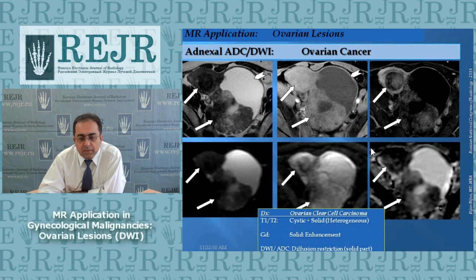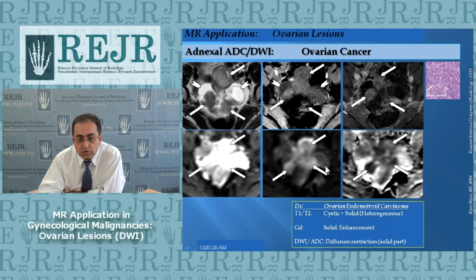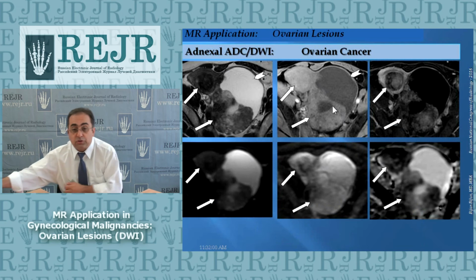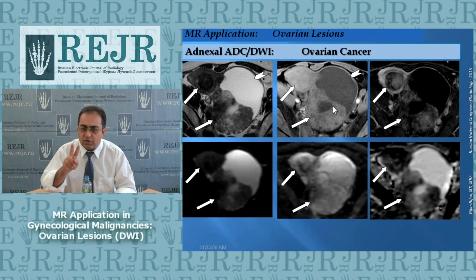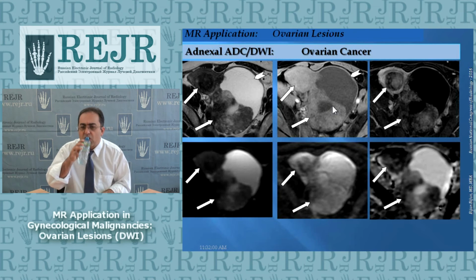This is another case, a clear cell carcinoma. The last two cases I showed you, this one, which is an endometrioid carcinoma, and then this one, which is the clear cell carcinoma, are the two tumors that are associated with endometriosis. So pay attention: whenever you have an endometrioma, you have to pay attention specifically to these two types of tumors.